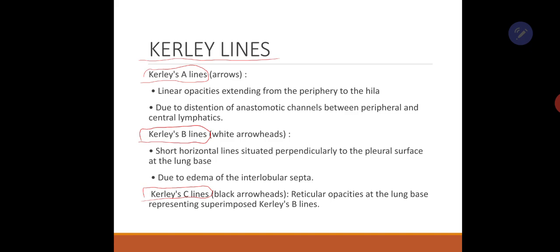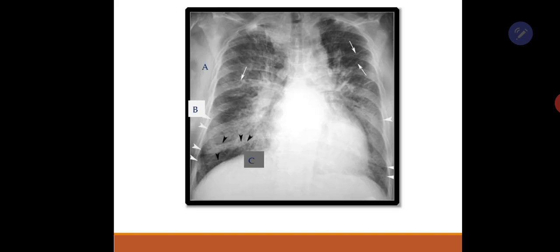Let me describe linear opacities. These are linear opacities extending from the periphery to the hilum.